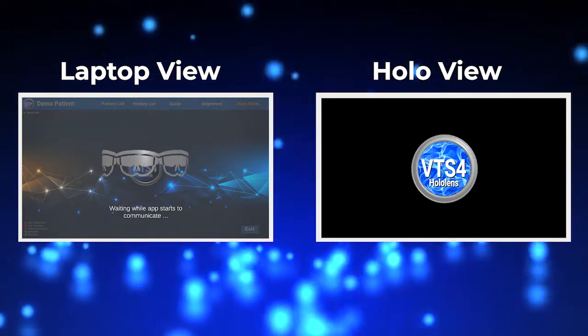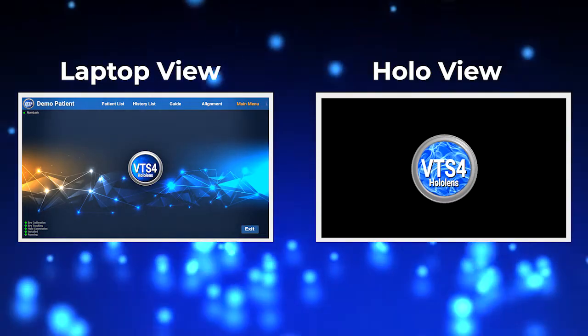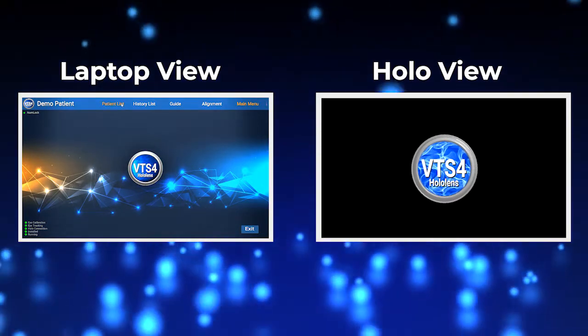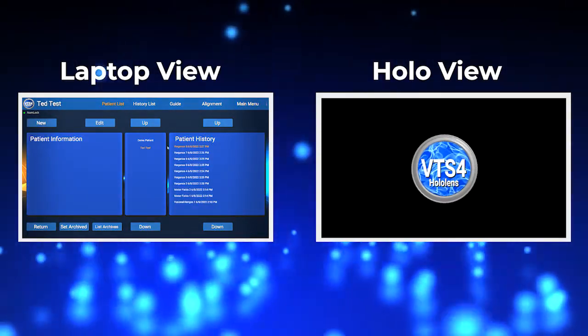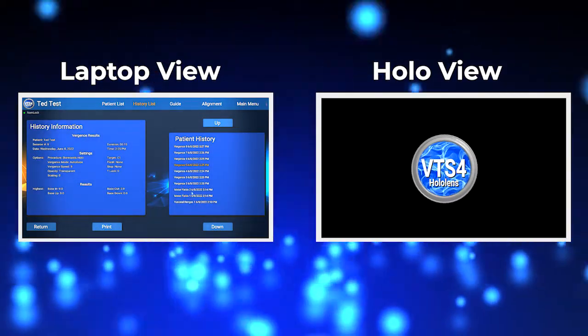After the HoloLens and laptop are connected and paired, they will remain connected until both are shut down. While the HoloLens and laptop are connected, the HoloLens does not have to be worn to view the patient list and the history list, but the headset must be worn before starting any of the procedures.